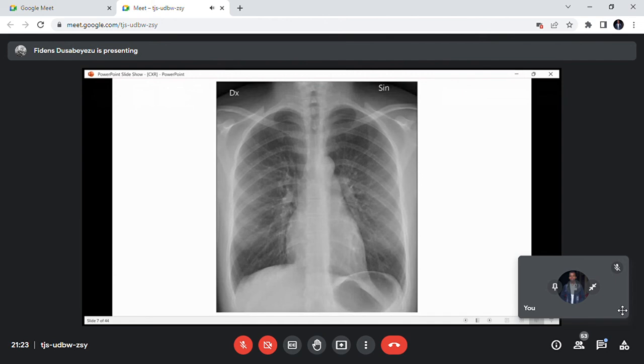Bones are even easier, because it's clear, you can see one bone from another. Let me tell you, make sure you check each bone one by one. Don't say the bones are okay without even checking. Check one by one. Check the clavicles. Check the shoulder joint. Check the spine. Check every single thing. And at the end now, you check number 4.